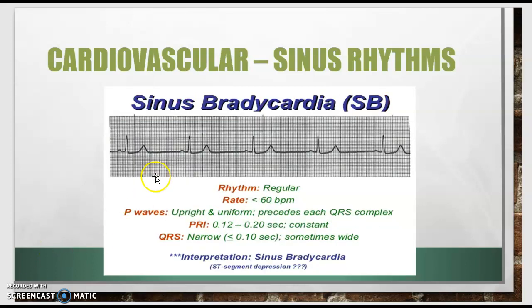So we're going to go to sinus bradycardia. Okay, and if you look through this information and compare it to what we saw on normal sinus rhythm, the only thing that's different is that our heart rate is less than 60. Okay, so we still have a P wave. They're uniform. Okay, they march out. We still have our QRSs. They're uniform and they march out.